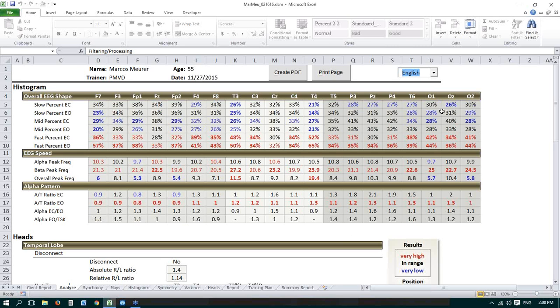And in the back of the brain, which is where we would expect to see slow frequencies, this person doesn't have them. There is basically a block into his subconscious. He's not interested in dealing with something down there. Fast alpha peak frequency in the back of the brain, also relatively okay in the front. Beta peak frequencies are quite high, indicating that there's a lot of high beta in his brain, but his overall peak frequencies are low, at least in the front here. So the front is basically shut down. His processing area isn't doing anything.